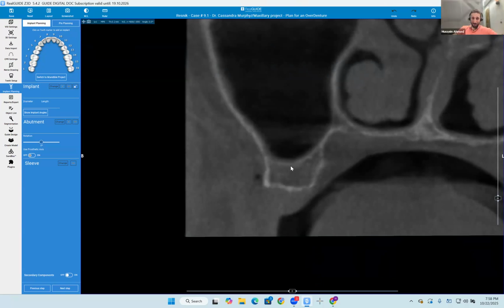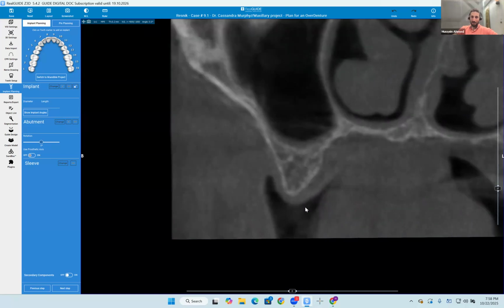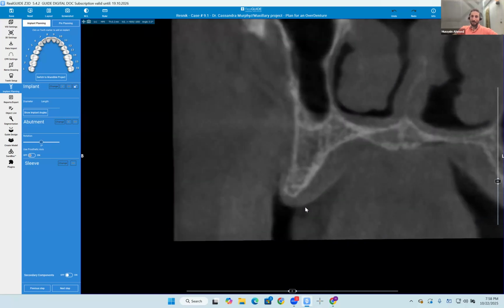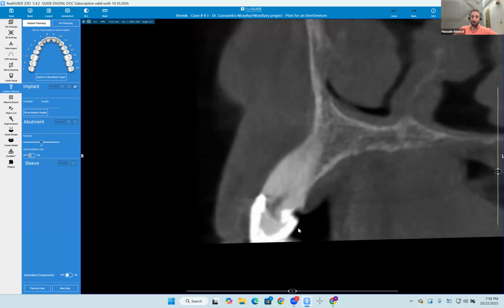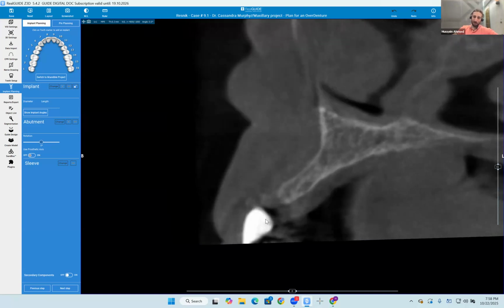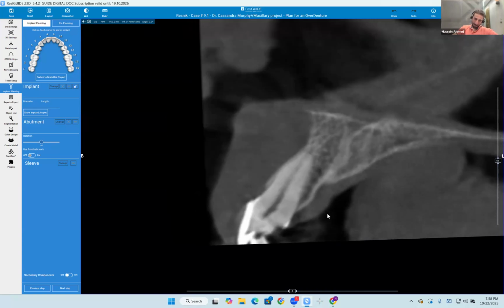So he's going to scroll from number 3 over. So pretty much at the right quadrant, Dr. Resnick, where we've got the right maxillary sinus, the native bone is approximately 3.3 millimeters over here, sir. As I keep on scrolling anteriorly, the height of bone above the sinus isn't that great. Then we're going to reach tooth number 6, where there is a crown which is not fully adapted to the lingual finish line over here. Then we've got the pontic, that's tooth number 7. The buccal lingual thickness of bone over here is not adequate. Then we're going to scroll to tooth number 8.